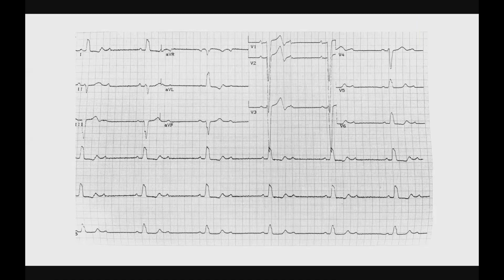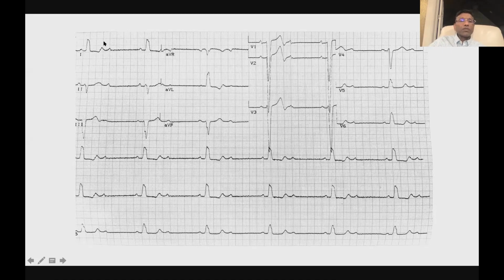Yeah, good shot picking out that you have really wide complex. The ones that I'd go along with you are these wide complex beats right across the screen. It looks like you're dealing with... What do you make of the wide complex? Any thoughts on that?